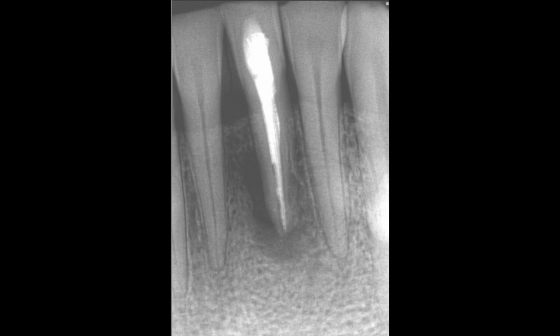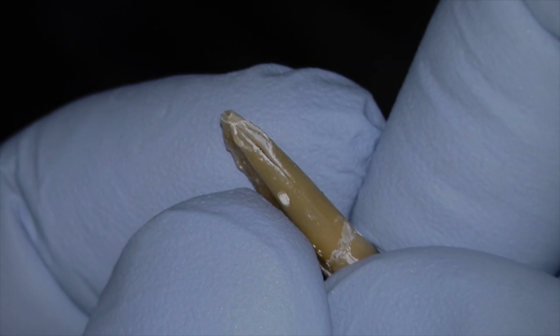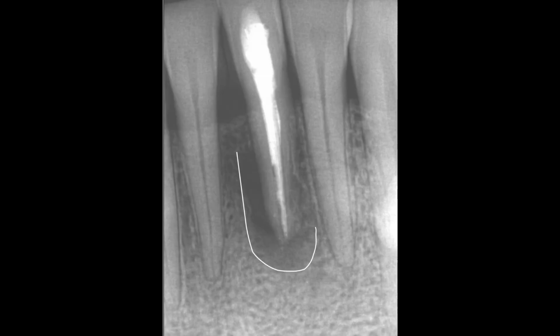And one of my colleagues had referred this case to an endodontist, and when I had the results back from the endodontist, when the patient was in my chair having symptoms, this is a classic vertical root fracture. So you can see the lesion here. It's called a J-shaped lesion, and he'd been asymptomatic for years. And by the time we saw him, it was like, okay, now it's become symptomatic. We have a diagnosis of a vertical root fracture.